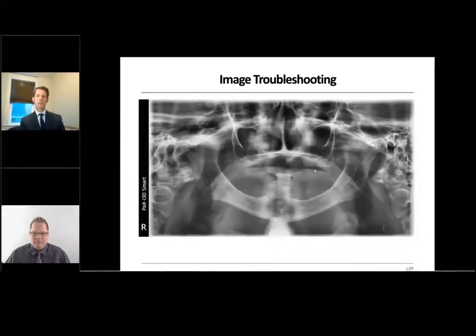I think what we're going to do is look at this image and see this dark shadow here. Paul, what is that? That's from not having the tongue to the roof of the mouth, or having that air behind the front teeth. Yeah, the shadowing there from the tongue. So I think offices and clinicians talk about it to the patient differently, which is fine, just whatever works. You want to have the tongue itself push to the surface of the palate, basically.